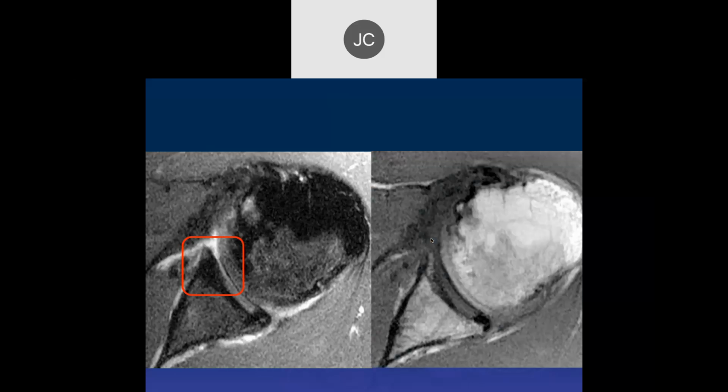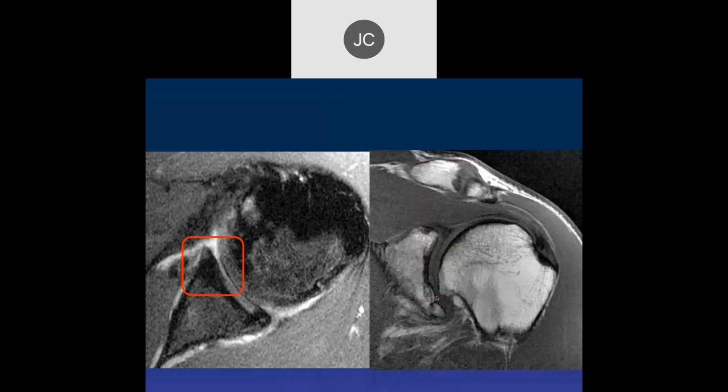And this is what the T1 weighted image looks like. So what's happening there to that anterior labrum? Might we have some fatty degeneration? Yeah, this is ossification of the anterior labrum. So this is all one big bone here, and that's the fat within the bone, which is suppressed with fat suppression. This is an indication that you just have a severe degenerative disease of that labrum, and when you go in there, it's just all bone.